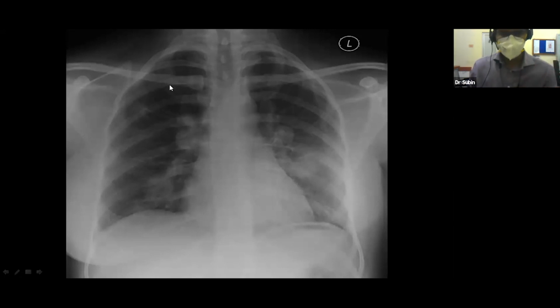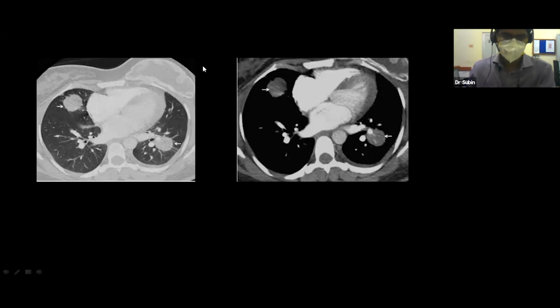It can be anywhere. It can be in the clavicle. Maybe you'll find some bony lesion here. Maybe one of the ribs got eroded. Maybe one breast could be absent. This is not a complete mastectomy. Actually, the patient had an implant. This is post mastectomy. The implant is also broken, from the membranes which are broken from inside, and these are the metastatic nodules which are seen.